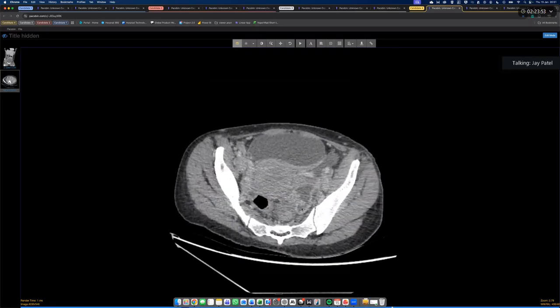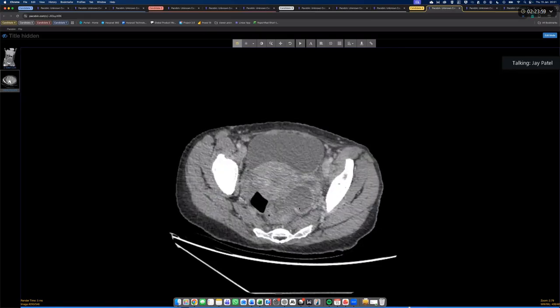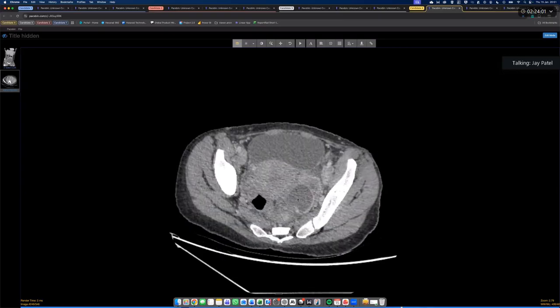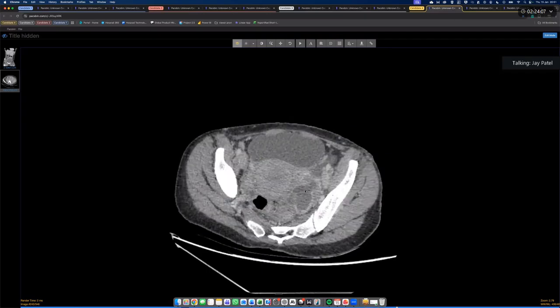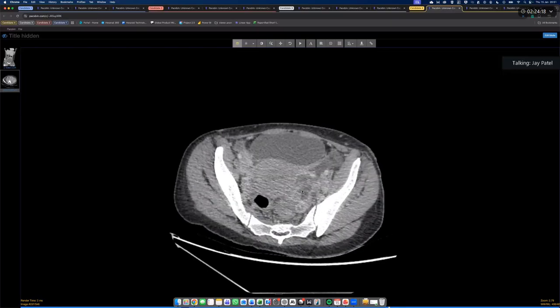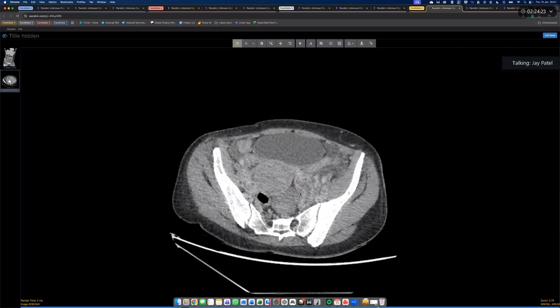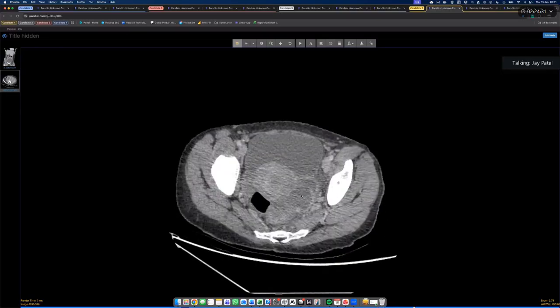there is a slightly hyper-enhancing tubular structure within the left side of the pelvis with predominantly cystic fluid density internal contents. I'm struggling to see if this connects to the bowel, given the generalized paucity of intra-abdominal fat. In view of that, I'm trying to identify if I can see the left ovary separately. I'm trying to see if the gonadal veins run into this structure, which might point me more towards suggesting it's fallopian in origin.